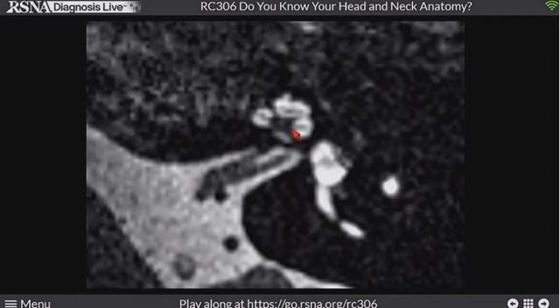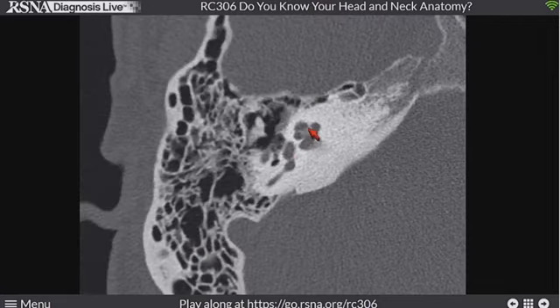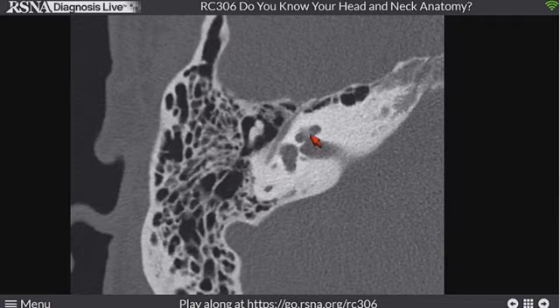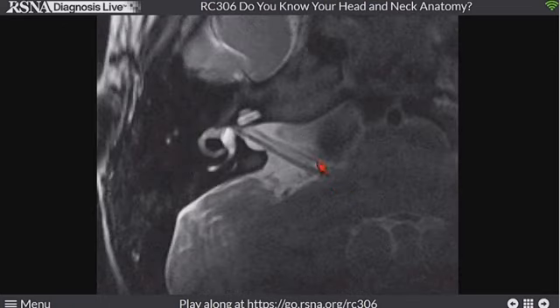So again, here's the modiolus, the bow tie in the middle. It's populated by the spiral ganglia. They all come together to form the cochlear nerve that goes to the IAC. On CT, again, here's that cochlea and the modiolus in the middle. There's that little cochlear nerve canal, and it goes to the internal auditory canal, and through the opening, or porus acusticus, the opening of the IAC, laterally within the cerebellopontine angle, or CPA. We're going to see the cisternal and CPA cistern segments better on MR. Whatever CSF bright sequence you're doing, T2 weighted image, CISS, SPACE, FIESTA, whatever your vendor's CSF bright sequence is.